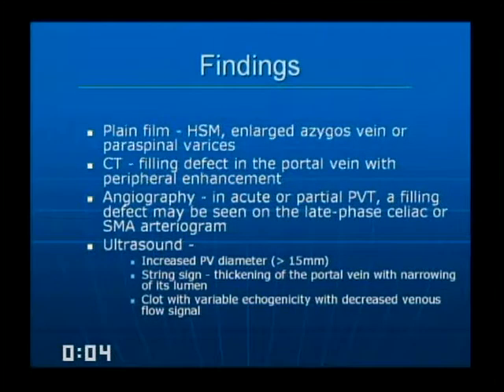I think most of us, even if we're not doing a Doppler exam, normally turn the Doppler on to measure the common bile duct. While you're doing that, don't forget to look at the portal veins. Very useful, particularly in patients with cirrhosis, and make sure there is no thrombus in the portal vein. It sort of gives you a little second look. That's how I do it, and that's how my tech does it. We don't go in the room in every case, but when you have a patient, certainly with cirrhosis, it's useful to note the portal vein, even if you're not doing it for Dopplers.